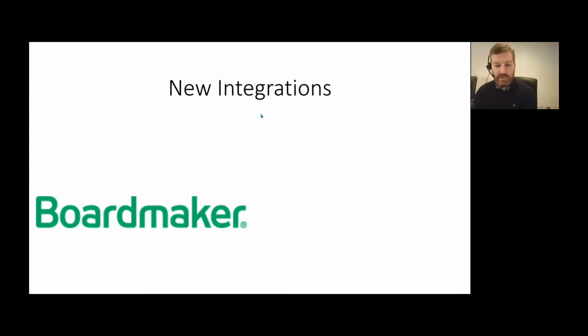So for the end user themselves, they don't have to jump between different software. They can bring all the resources that they're working on, maybe in school, and use it through TD Snap, and they can use it within the same layout, so they're not getting confused on different software. And if they're used to navigating within TD Snap, they can now use their Boardmaker activities. So if you're a school and you've created activities, you can send it directly to their device, and they can access those activities within TD Snap.